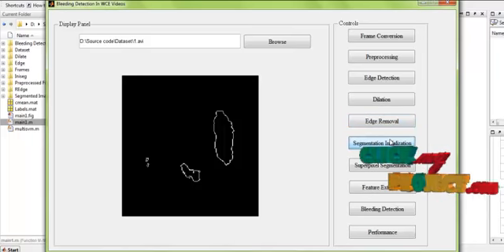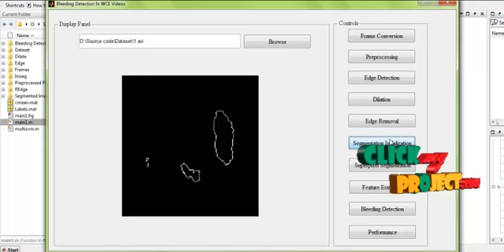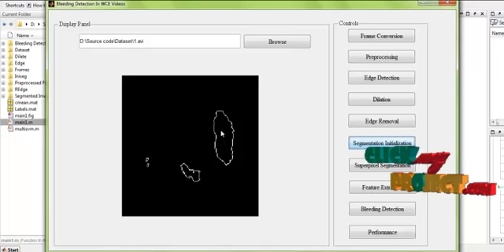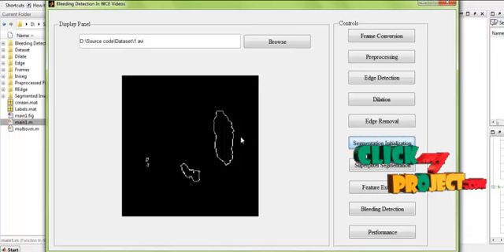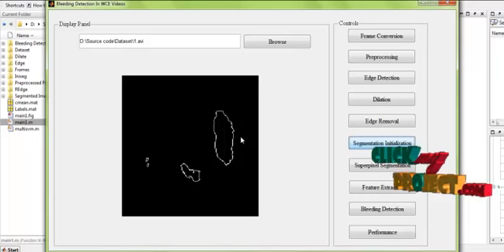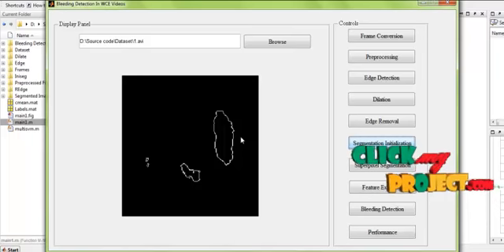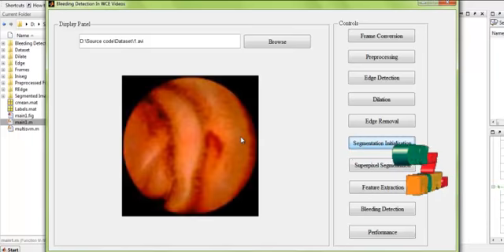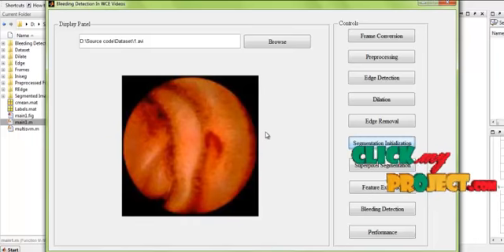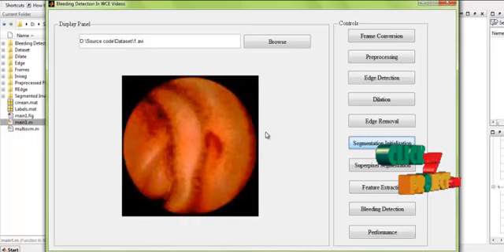The superpixel segmentation initialization is employed, which is based on the comparison of these detected edge regions with the original images and placing these edges in the original images. The detected regions were placed in the original image, and based on that, the regions in the images that are to be used for segmentation are initialized.